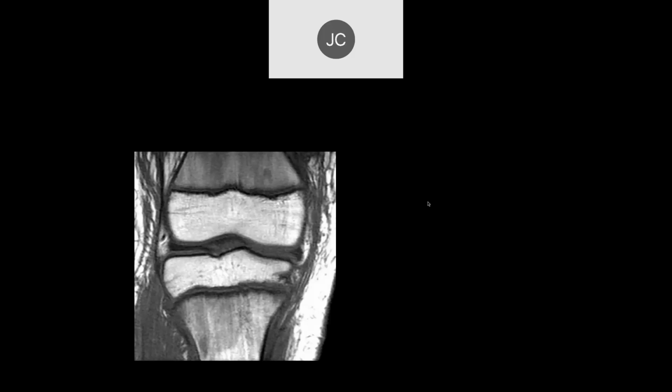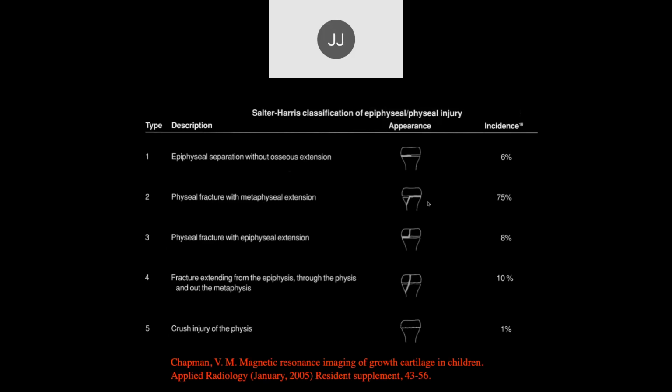There's a fracture of the tibia that has a periosteal ring on at the physis, and there's a twisting injury that can produce a fracture, and it's called number 6 because one of the problems with it is you get premature closure in an area of the torque pressure, and so the periosteum, I mean, there's premature healing in that area, and you get a bone bar, which can be a problem in the future, which you have to remove, obviously, and replace it with fat.